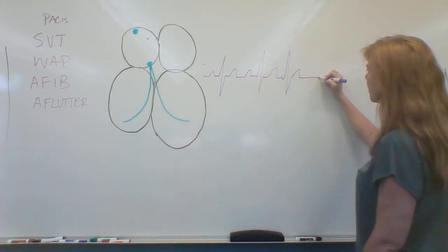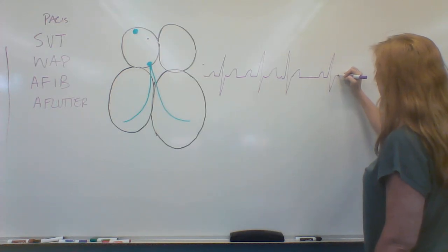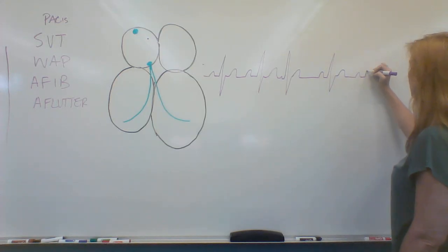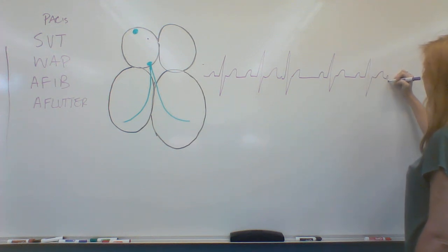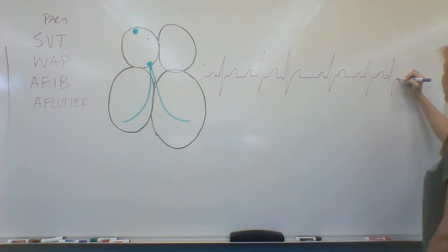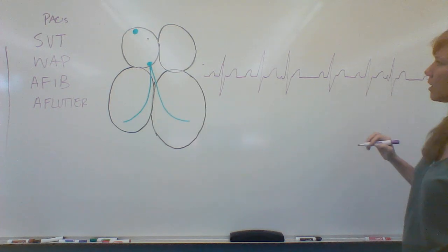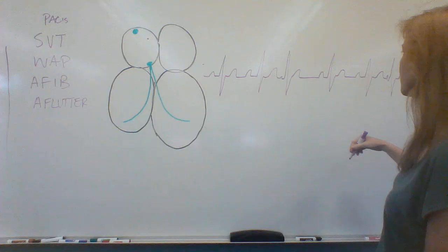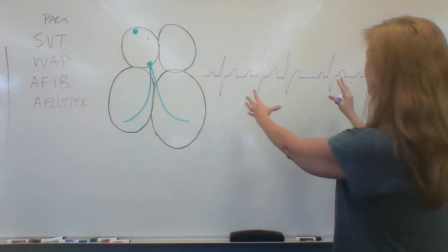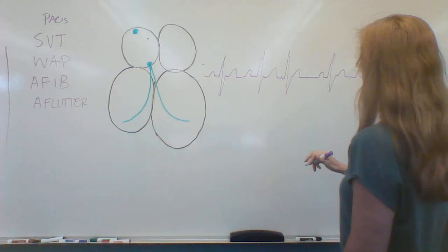A little space after it. Sinus beat, T wave, something scrunched up right next to it. And it doesn't have to go in a pattern. It can go in a pattern, but it doesn't have to. And so then as I start looking at this patient's heart rhythm, what I start to notice is there's some pairs occurring with little spaces after it.